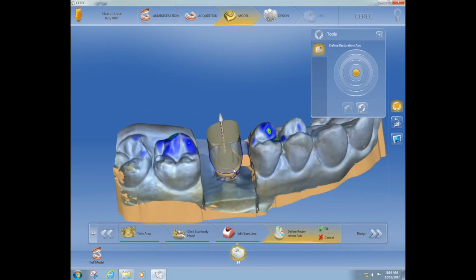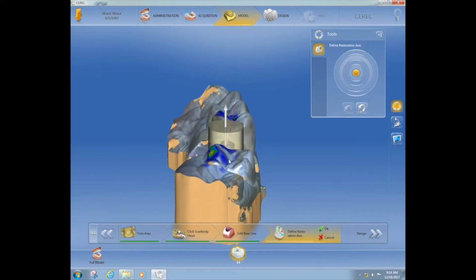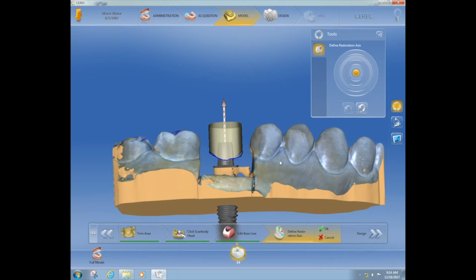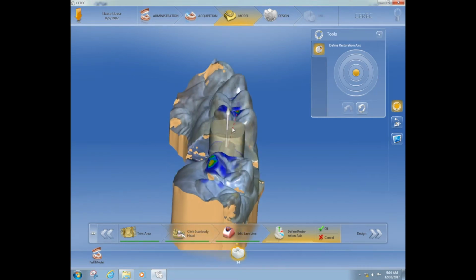Now this really depends on how the implant was placed. The software is showing you what would be straight up and down, and you'll see the dotted line is that implant. That implant was actually placed a little buccal, probably a little bit too buccal. That's why we want to try to do guided surgery. But since this is a screw-retained full contour, our main concern is really the straight up and down path of insertion, as you can see the contacts. So if I were to leave it right here, the hole of the screw channel will be more to the buccal, almost up into your buccal cusp.